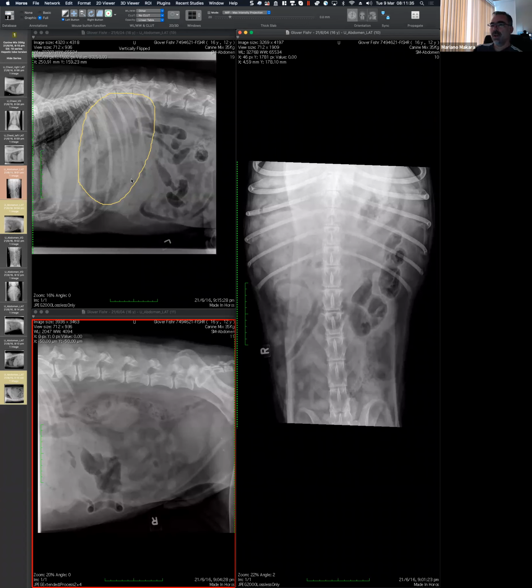Okay, yeah. So I think it's a good time to open the discussion and let others contribute to that image. And as soon as we define it a bit better, my suggestion is, when you are a bit lost, which you have the right to be in a situation like this, you need to go back to the principles. The principles are: whatever I'm seeing, even before deciding where it belongs, where is it coming from?